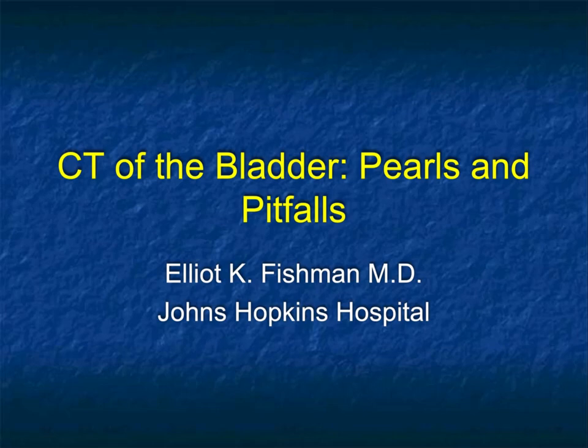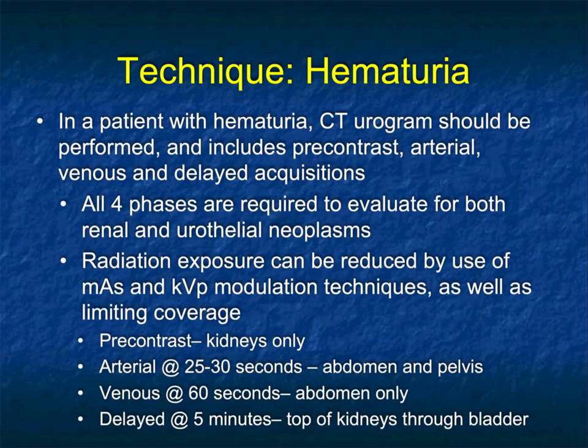This is going to be a brief talk on CT of the bladder, pearls and pitfalls. I will come back to the bladder at a later date and give you an extensive review of bladder pathology, but I've been asked a number of questions recently about the bladder and thought I would give you some pearls and pitfalls, not the entire bladder, but some very specific comments.